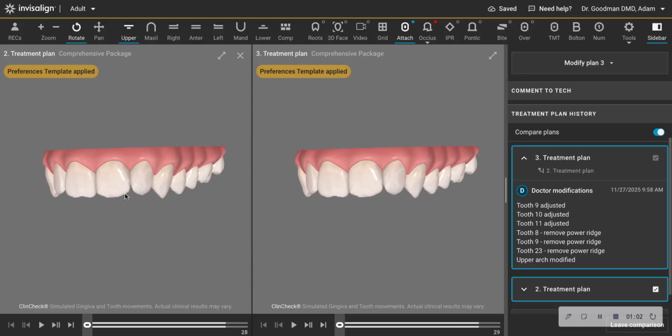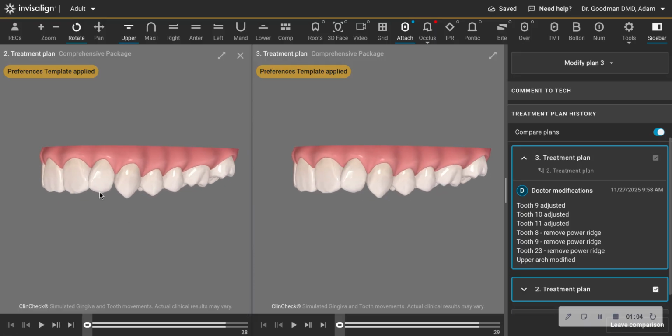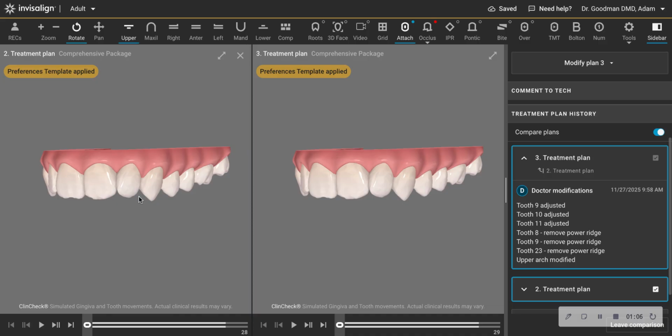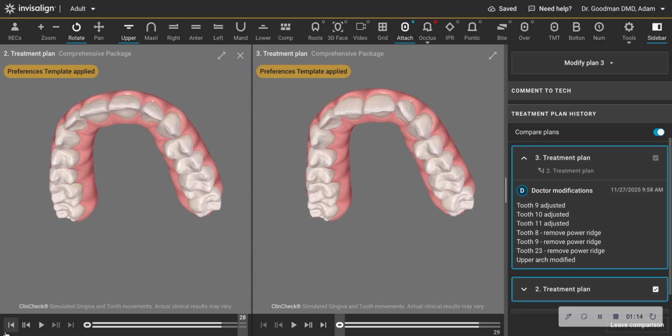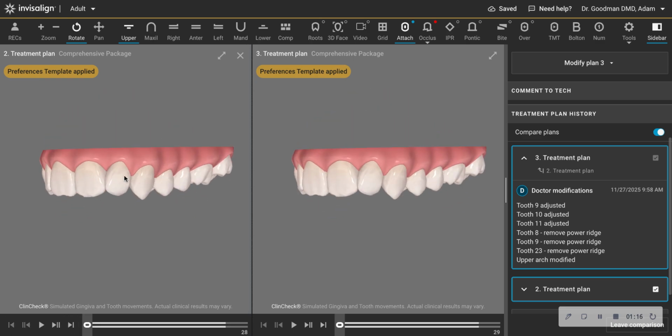But as with a lot of adults, the incisal edge morphology sometimes is worn based on the current position of the teeth. And so the challenge of this movement, rotating it in on the mesial, that's not as challenging, but getting a purchase on this tooth to move that root upright, you definitely need an attachment, and even with it, it's just a short, flat tooth.